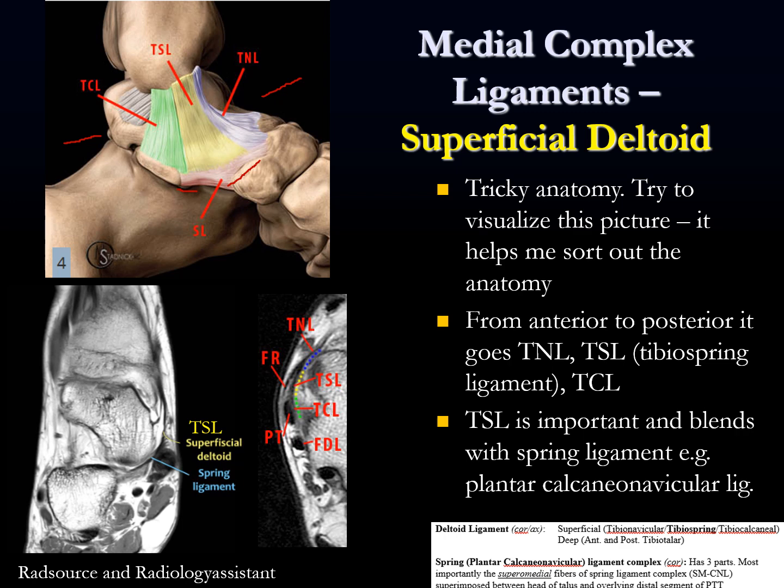Here's another look at a normal. So this is the same thing here, where you see this tibial spring ligament here. It's coming down, and it's making its transition as the spring ligament here. So you just see that nice thin structure that comes down and makes this kind of arch support on this talus. Adjacent to that, we have a tibialis posterior, which may or may not be abnormal. Looks a little thick there to me. Okay, and that's the coronal.